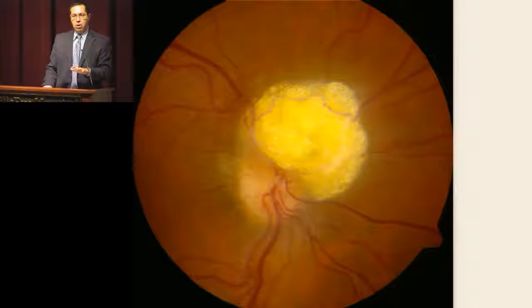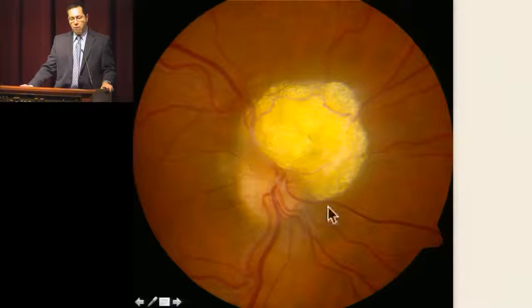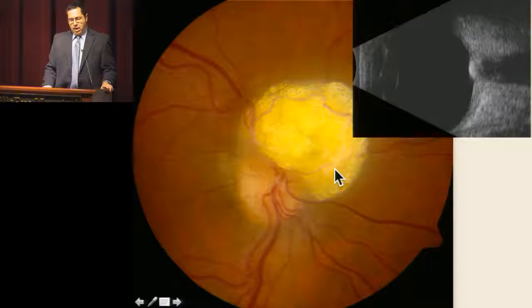This is the typical calcified type. I mean, you see one and you never forget it. Many of them actually are located around the optic nerve head. You can see these yellow, round, calcified lesions. And when you do ultrasound, you will see that it's echo-dense. That's because of its calcium content. You see it's casting a shadow there, so it's calcified.